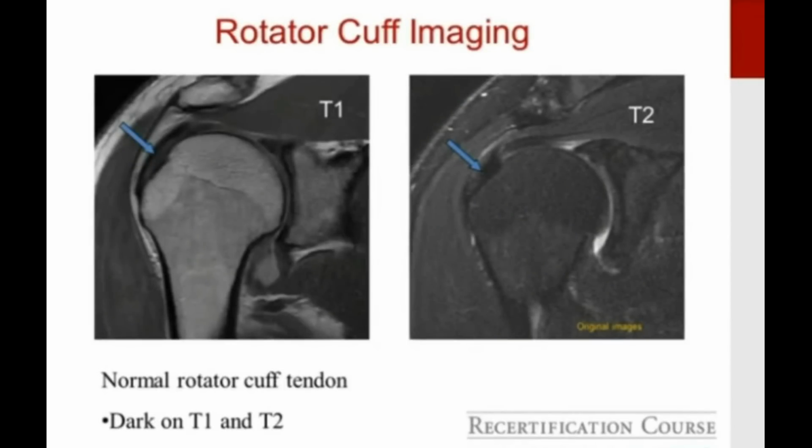The rotator cuff musculotendinous junction typically sits in the 12 o'clock position when we're looking at the MRI in the coronal imaging plane. As you move peripherally, as the tendon comes over to insert into bone, it should be a uniform thickness, uniform low signal, which extends right down and attaches to the uniformly black cortical line. So this is the normal appearance of the cuff.